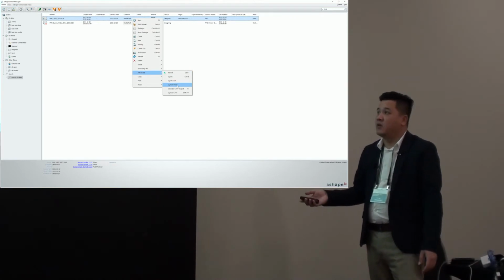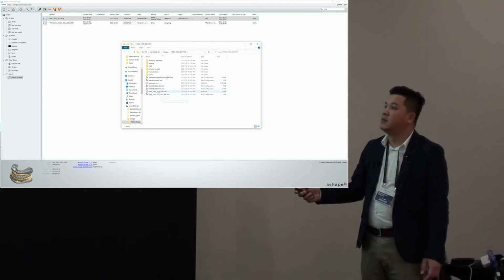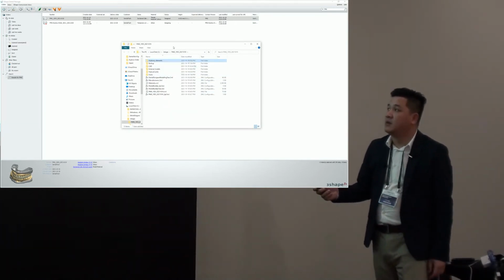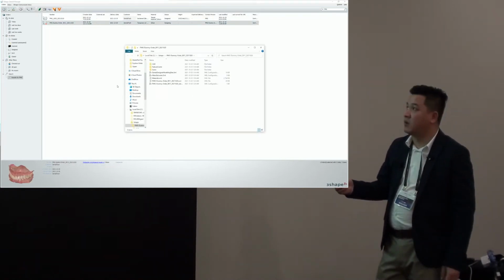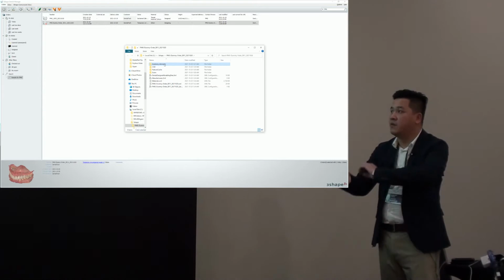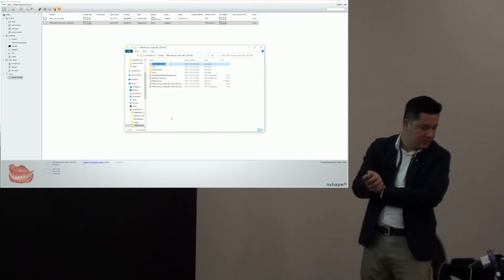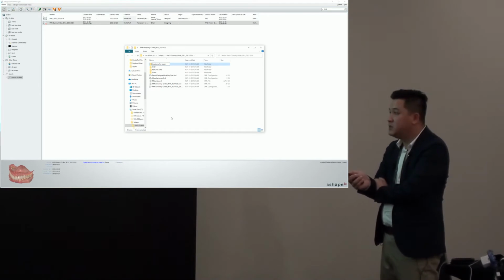And then we make another order, go back, reset our one order here, import the newly aligned scans into proper alignment, and then we're also going to grab our anatomy elements folder that I was telling you about earlier. We're going to go here, right click, advanced, explore, and then right click, paste our new folder, and rename it "anatomy for reuse." If you can't see it here, I apologize. It should be a little bit higher resolution, but it's not. But it's "anatomy for reuse."